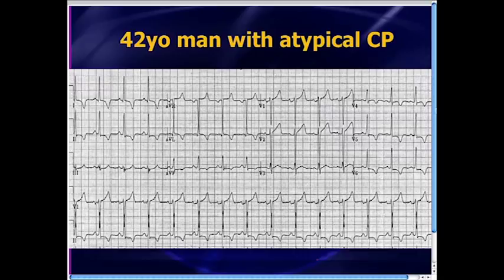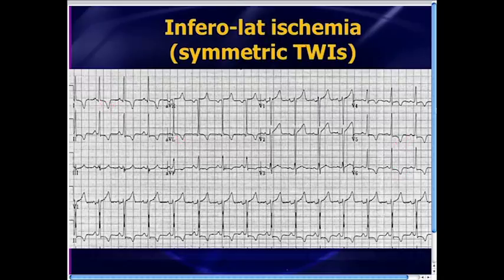Now, take a look at this. Okay. In this particular case, the patient has LVH. The R wave in AVL is greater than 11. And there's flipped T waves in 1 and AVL. But these flipped T waves, you'll notice, they tend to be more symmetric in appearance. I don't know if my drawing is helping or making things worse, but take a look at how symmetric those T waves are. Those are not typical for strain flipped T waves. This patient actually had LVH, but this patient did have a bump in troponins and had lateral wall ischemia, which resolved with treatment.